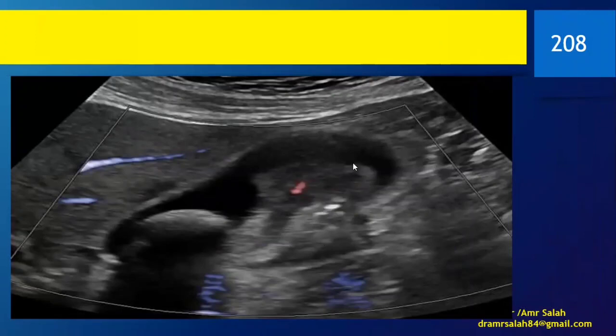In this case, as we have said, there is a soft tissue mass, okay, like a polyp, but with a stone. This increased the high risk of malignancy, and in fact, this patient proved to have gallbladder cancer.